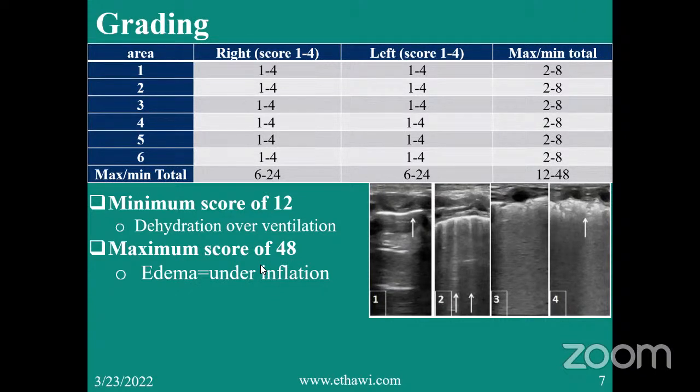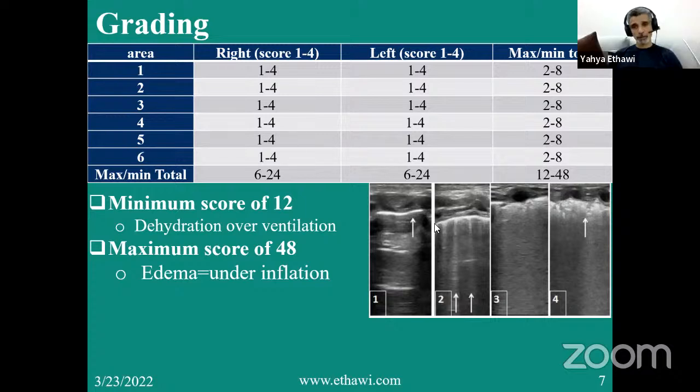Questions? Yes, sir. It's all clear, but I was looking at 3 and 4. The pictures in 3 and 4 are sort of the same to me, apart from the pleura. In 4, there is some bronchogram. They are not actually the same, doctor. You can see the B lines are sometimes separated, and you can see that the pleura is still there a little bit. But here you'll see that the consolidation becomes more and it's completely matted.